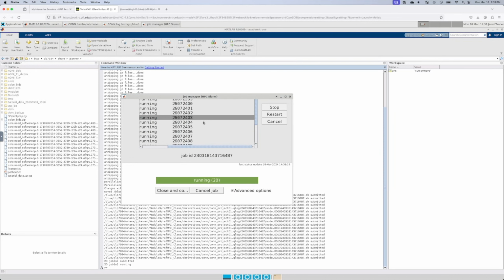It should be working. If you're doing this, you might have some of these end with errors. A lot of things can go wrong. We're just going to assume things don't go wrong. If you're following along and you've been fastidious, very conscientious and careful with all of this, it should work. We shouldn't have any errors.